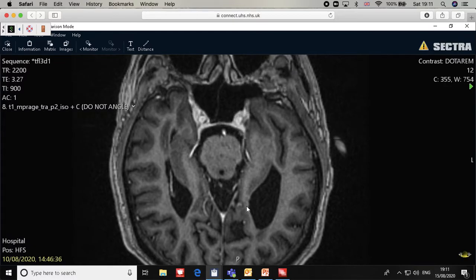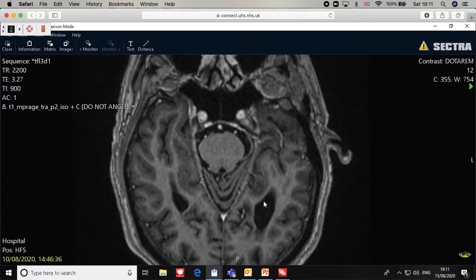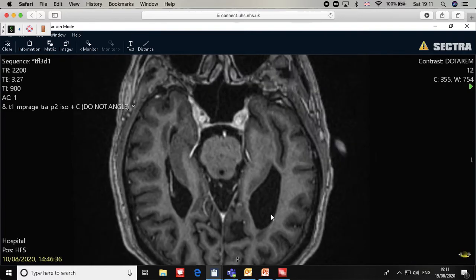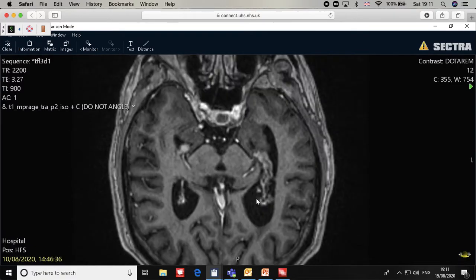The hippocampus will reach the area where the splenium is located, and then it will end there. I'm sorry, just a second. It's slow. Okay, good. So here you can see it. It is going very close to the splenium.